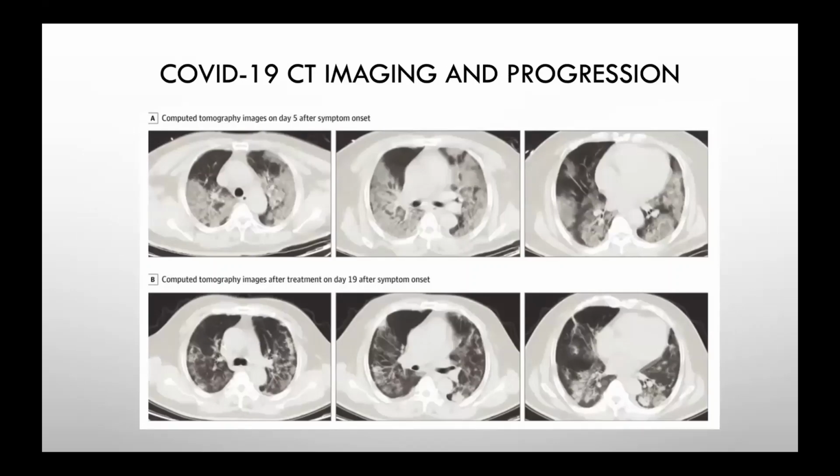So day 5, this is a slightly more hopeful series of pictures in that you can see that some people do get better. The top 3 pictures are day 5, which is usually when patients really deteriorate if they're going to. And you can see there's really some extensive ground glass consolidation, which is really forming into dense white consolidation all over the lung. And thankfully, this chap recovered. And you can see that his consolidation is actually clearing up.